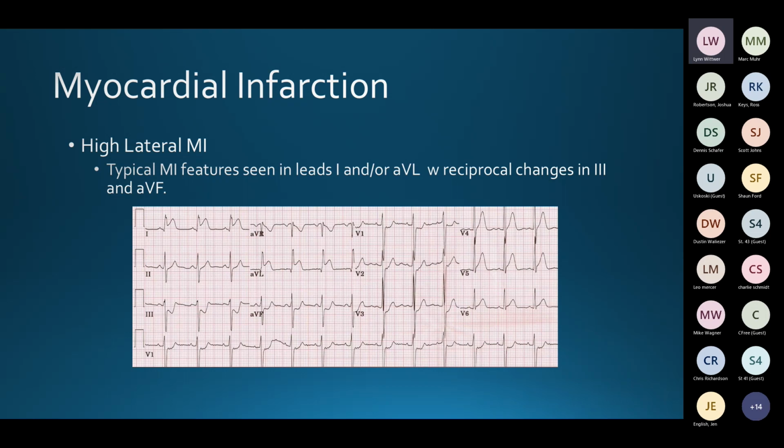So, whereas we don't really want you to call this a STEMI, I would still bring it in code 3 and say you've got ST elevation in only AVR.